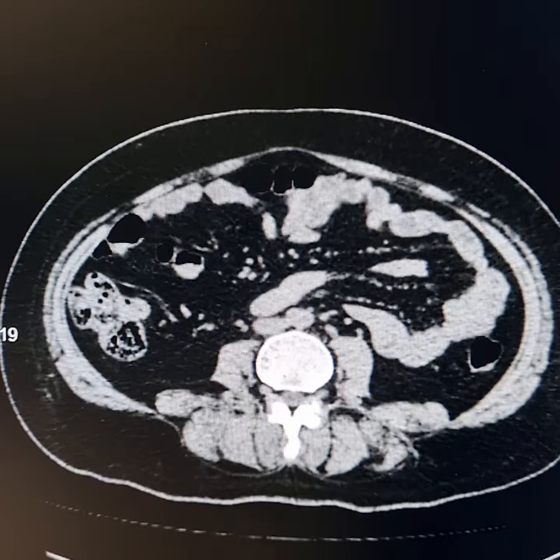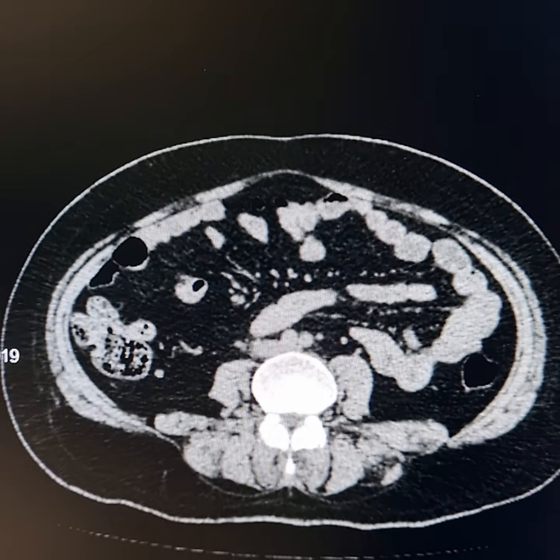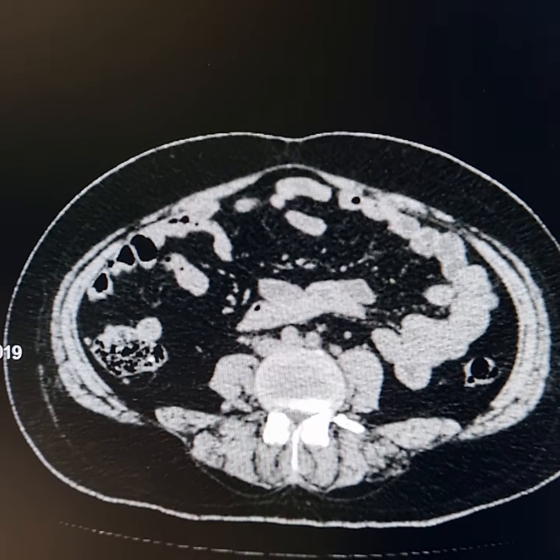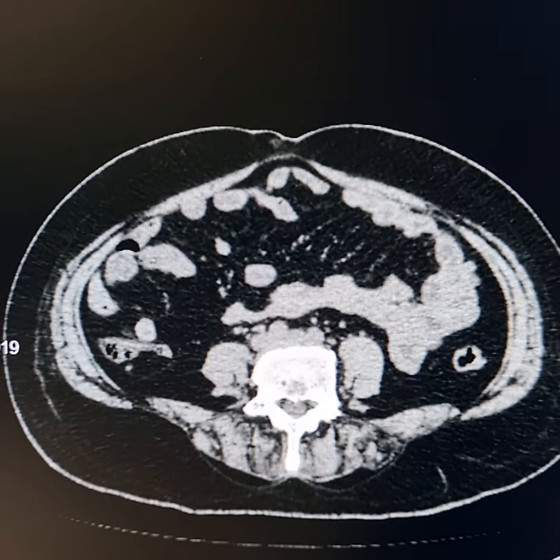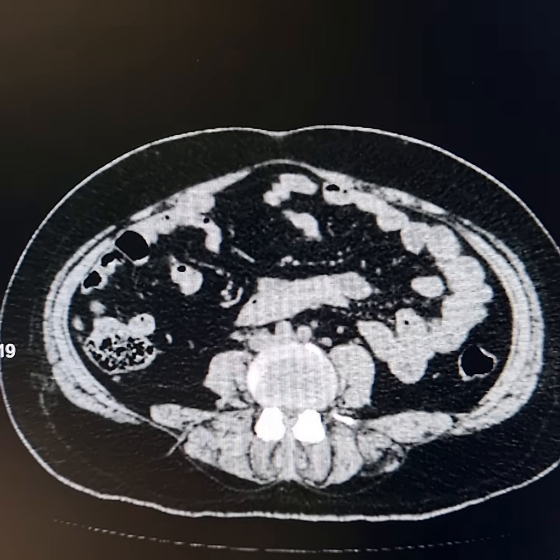This is a CT IVU of a 42-year-old female patient. She had a hysterectomy about 10 days ago. Now the patient has presented with urinary incontinence. A Foley's catheter was passed, but even then the patient complains of passing urine into the pamper. The patient was sent to me for an ultrasound of the pelvis.